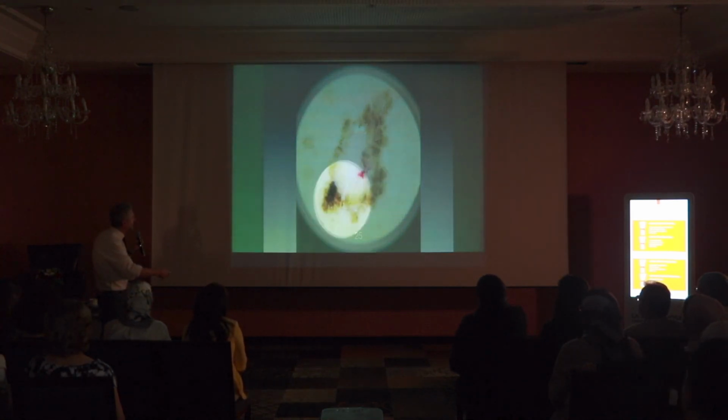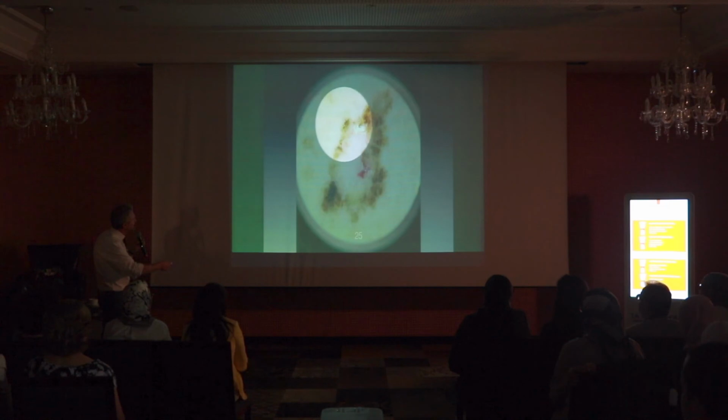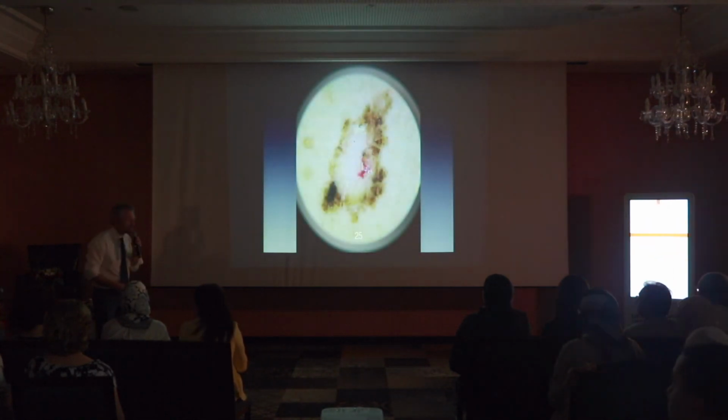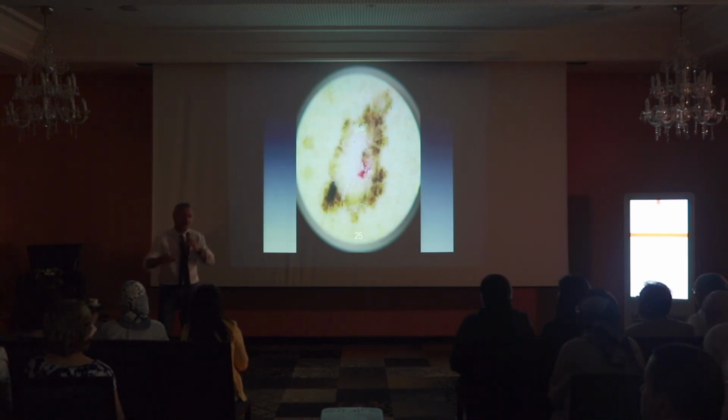What about 25? Well, okay, but don't you think that this is network? Maybe you don't see it too well, but I would say that this is more on the side of a melanocytic brown color, and this is regression again. So this is melanoma as well, and these last 2 melanomas also have something in common.